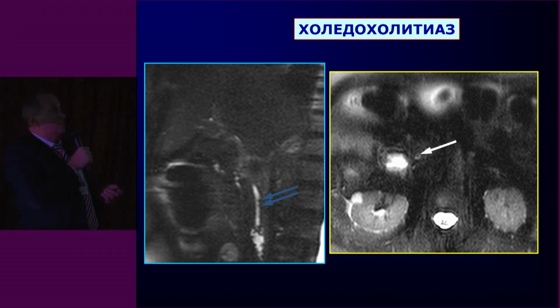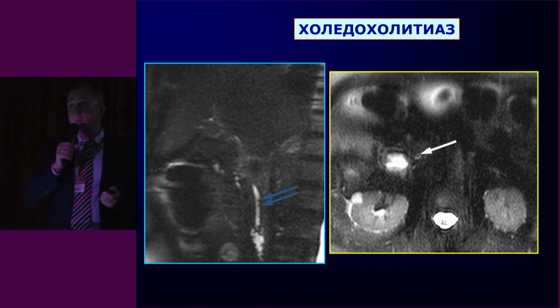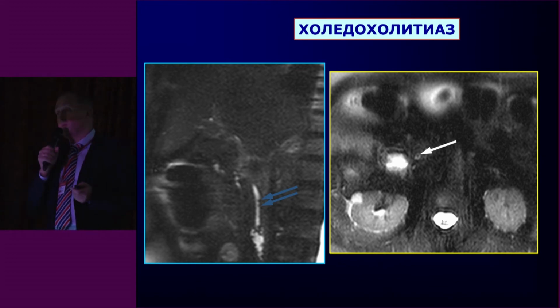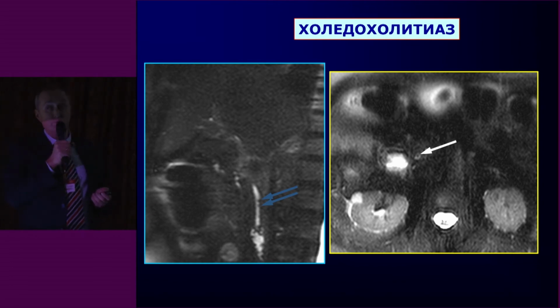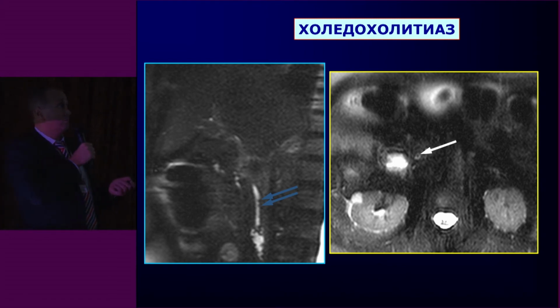So it's one of the signs of biliary hypertension. Of course, it's very important to find such inclusions in the CBD, and different sources say that up to 70% of stones in the CBD are found in cases with a non-expanded CBD. If you cannot visualize the retroduodenal part of the CBD, you might say there is no problem, it's not dilated, but there is a problem.